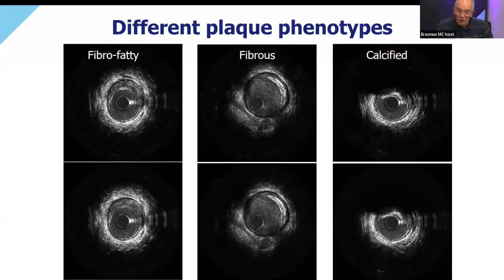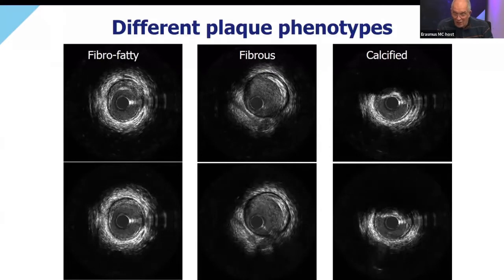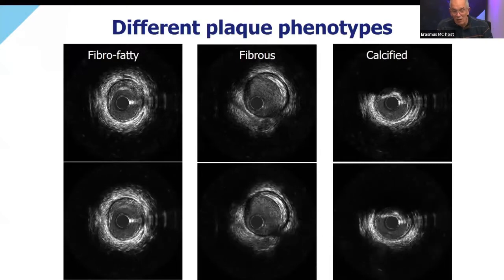So everything will be reflected, and what goes through will find this wall of calcium on its way back. So behind the calcium, we will not see any information, so the picture stays dark. That's different than the homogeneity of the media, because there you can look through the black appearance.